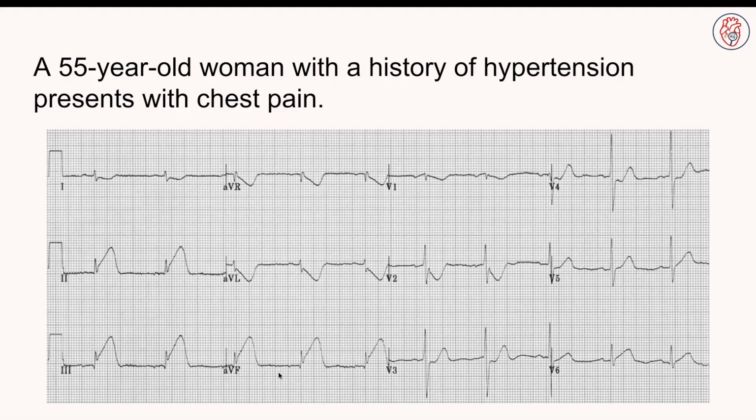over here. Okay, so what I'm going to do first is look and see if there is a pattern. Is it in certain leads and not others? Are there reciprocal changes? Hopefully that sounds familiar. In order to have a STEMI, we also want to see the reciprocal changes, because if we have ST elevation everywhere, then we're thinking of different diagnoses, different differentials, right?